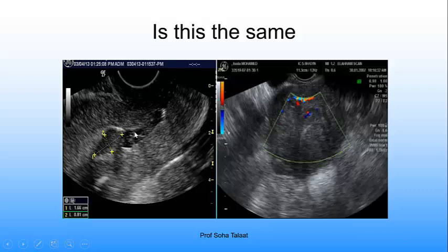If you have a look down to this, we have another lesion here showing cystic changes, and this is a polyp. It's not so hyperechoic, but there are cystic changes present inside, and there is no myometrial base. Here also, this is an isoechoic mass lesion, small, but it has a perifibroid plexus and not the vascular pedicle sign, and so this is an intracavitary fibroid. So many times, if the lesion is small and we can delineate the surroundings, we can differentiate between polyp and fibroid on an ultrasound basis.